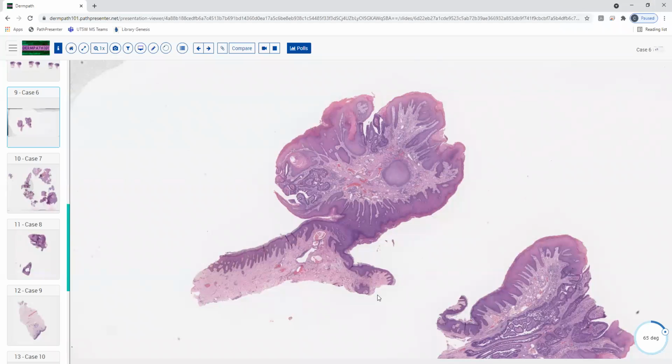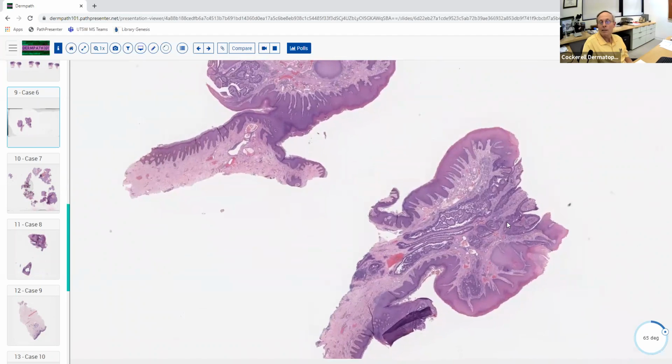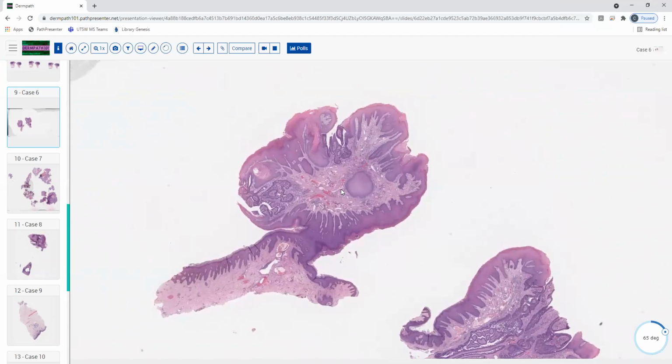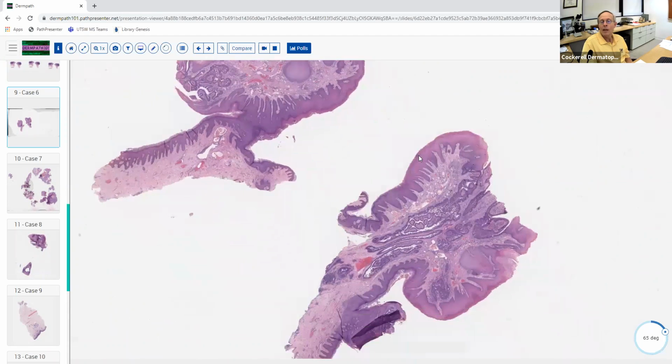And so looking at the papillomatous structures specifically, because I think that's what we're going for, you see what looks like more basophilic cells rimming the papillae, and that makes me think of something ductal. So you think it's a neoplasm? Yes. Okay, good. Neoplastic. And would you favor benign or malignant here? At this point, I think I would favor something more benign. Yeah, it's very small. It's very focal. So we would almost certainly favor a benign process here.